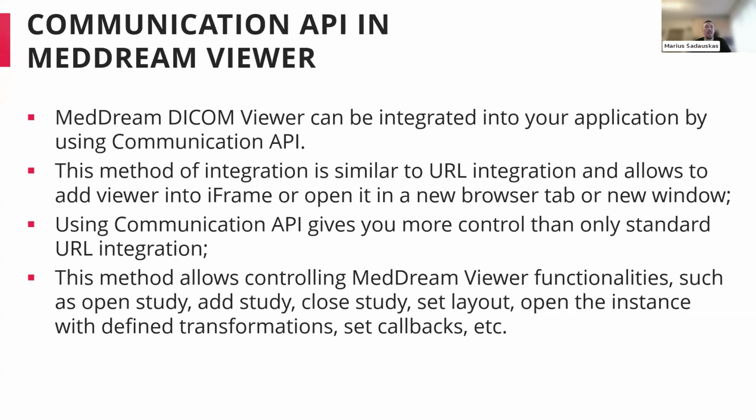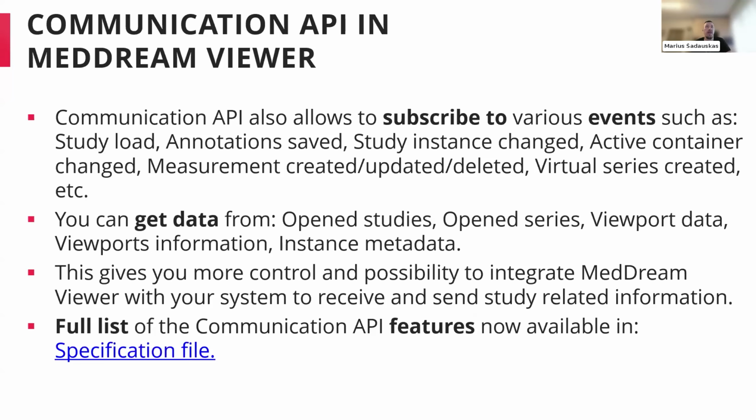For example, you can define how you want to open the studies, how to add studies, how to close them, how to change the layout, open some specific instance with a defined transformation, set some callbacks, and so on. This bunch of functionalities allows you to have a very flexible solution created with your application and with the MedDream Viewer.